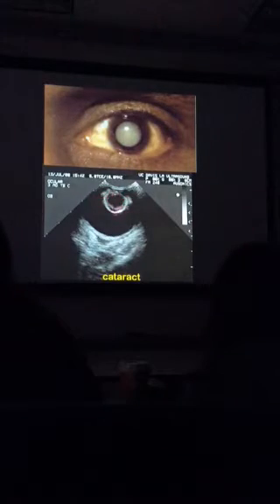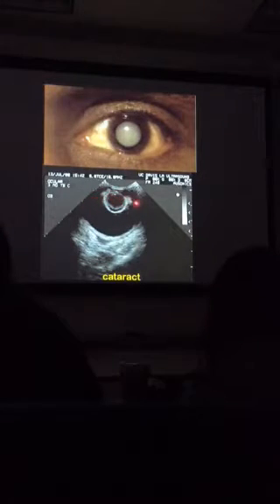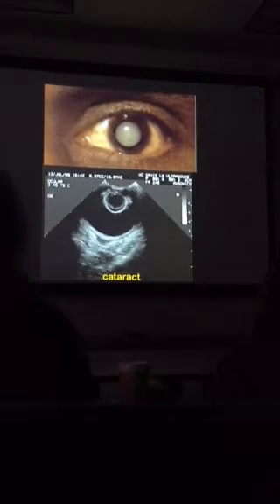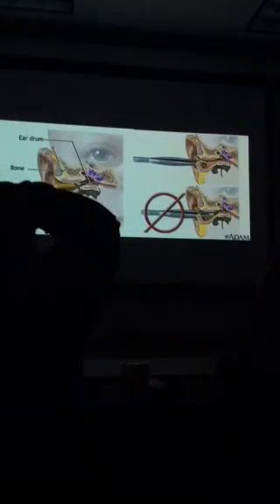Cataracts, again, see nicely with ultrasound. Remember the lens should be kind of a football shape going across here. And this is a hardened, thickened crystalline lens that has become basically opaque. It's hard to see through that lens. And so they do lens transplants now.